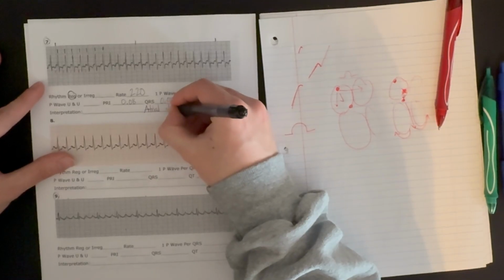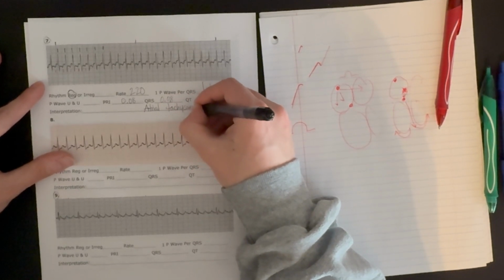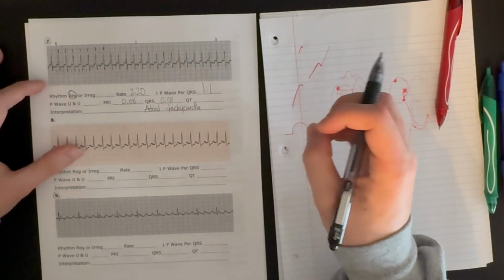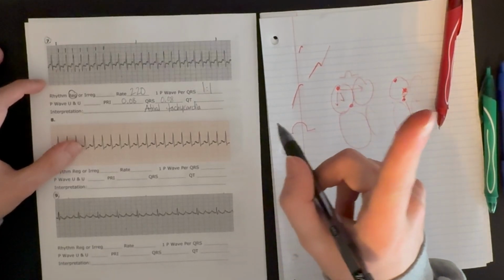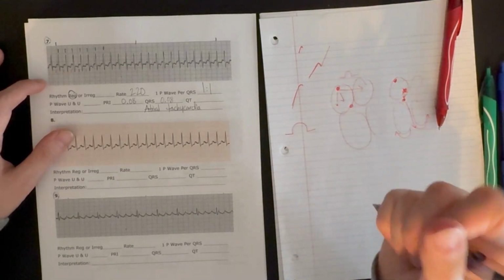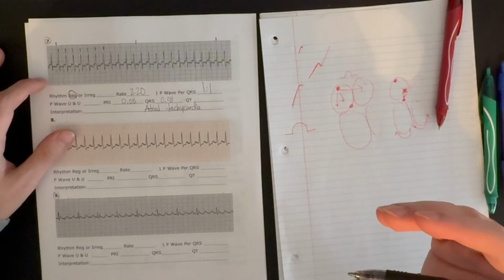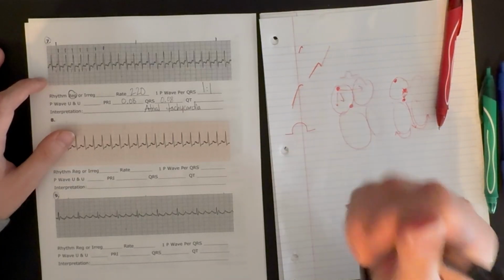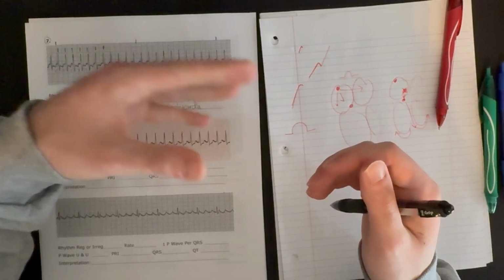It is a tachycardia that is originating from some sort of irritated tissue, and it's very important. It is originating from one area of tissue in the atria that is firing extremely fast, and it is depolarizing the atria and then getting to the AV node and depolarizing the ventricles on its own, preventing the SA node from controlling this conductive system anymore.